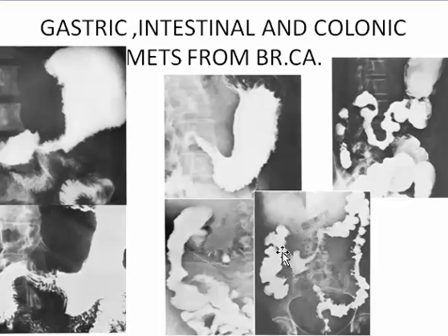Subserosal deposits invading the colon, causing irregular segments of narrowing, scattered along the whole length of the colon, similar appearance, and here at the gastroduodenal region. Gastroduodenal subserosal deposits. Of course, the small intestine are also involved.